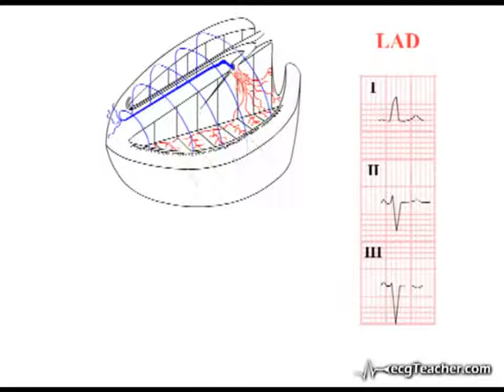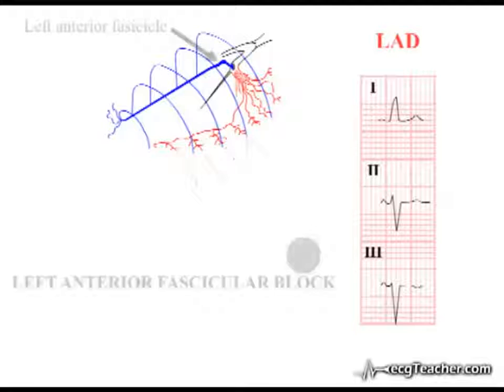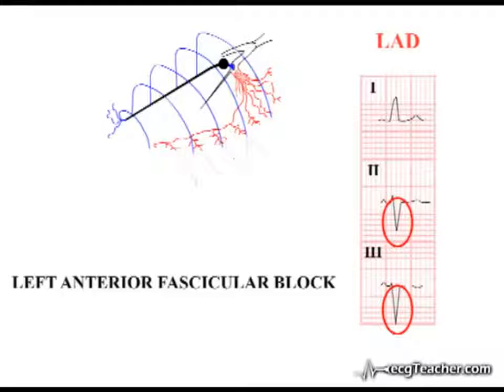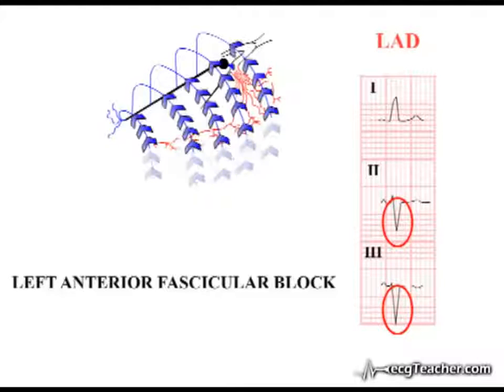The commonest cause of this abnormal ECG finding is left anterior fascicular block. In physical terms, the deep terminal S waves observed in this situation in the inferior leads result from the retrograde depolarization of the lateral and anterior left ventricular wall. This depolarizing force is slightly delayed relative to normal and spreads upwards from the anastomoses in the lateral wall. As it is moving away from leads 2 and 3, a negative deflection is produced in these leads.